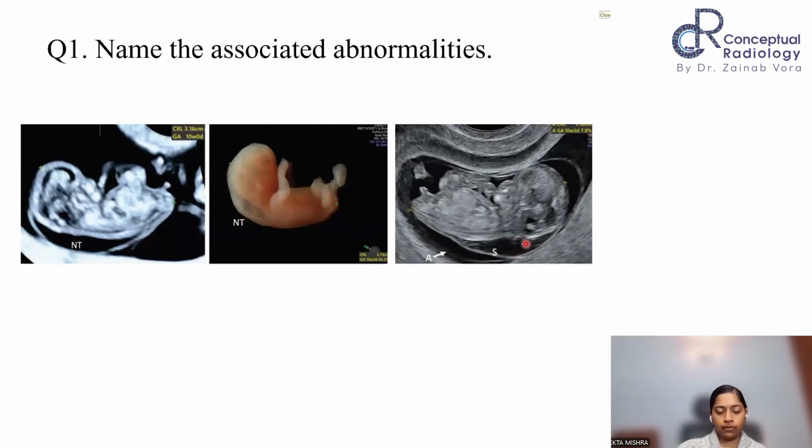Okay, the finding is increased NT. Start telling me what the associated abnormalities are. Very good.